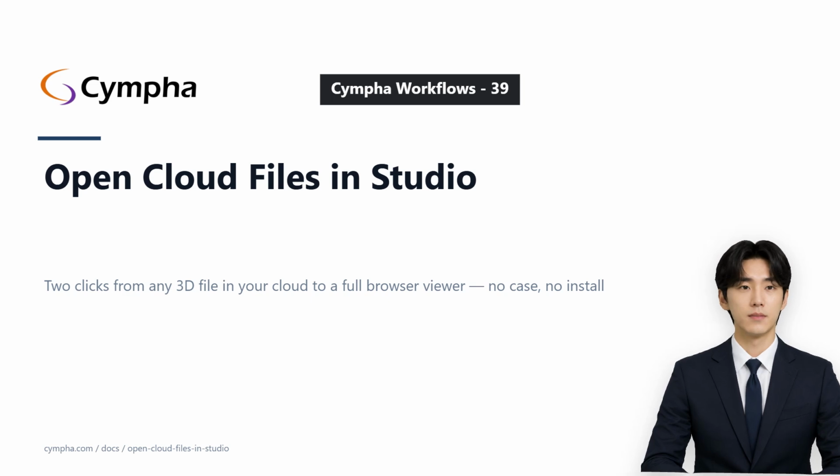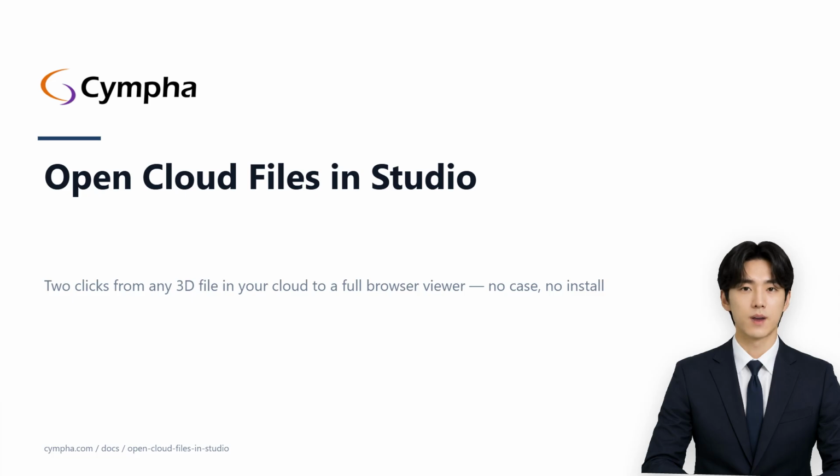Welcome to Guide Mia. Today we're going to talk about opening cloud files in Cympha Studio. You have a file in your cloud, a scan, a treatment plan, a project bundle, and you want to look at it properly, orbit it, measure it, screenshot it. You don't need a case for that, and you don't need to install anything. Studio runs entirely in the browser, and every viewable file in your cloud is 2 clicks away from it.